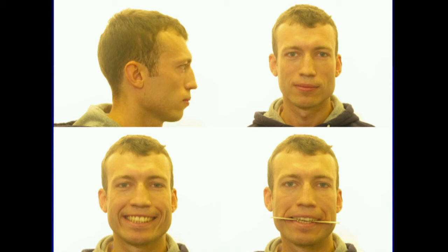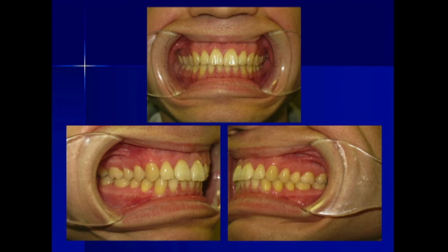The occlusion is fantastic. Am I right? Yeah. I'm not going to do a final splint. No, no, that's easy. And may I ask one more question? Would you place a screw in glabella point, like a landmark? For control. For control, yes. Measurements. Yeah. Thank you.